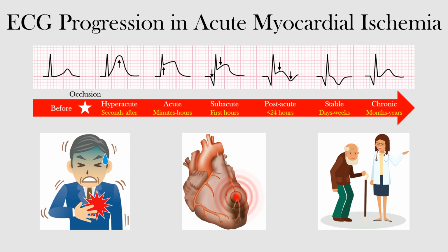So if you look here, our patient comes in having these episodic chest pain episodes on exertion, but notice that before any occlusion occurs, we have a normal EKG. No ST deviation, normal upright T wave, no QRS changes. Okay, so everything is normal on the EKG.